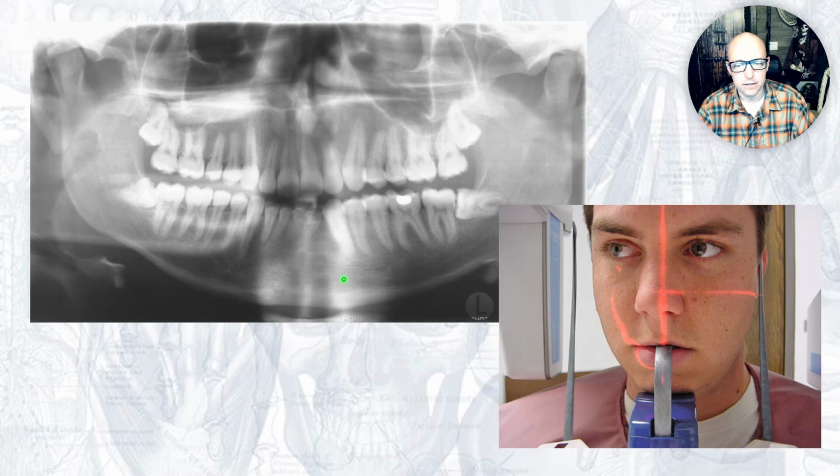All right, in this case, he kind of gave it away with how he looks. Is this right in the center? No. It's off center a bit. His head is rotated a little to the right. Does that make sense with what we're saying here? And this is not too extreme of an example. See how there's not too much overlap?